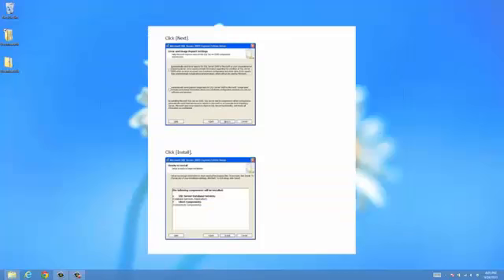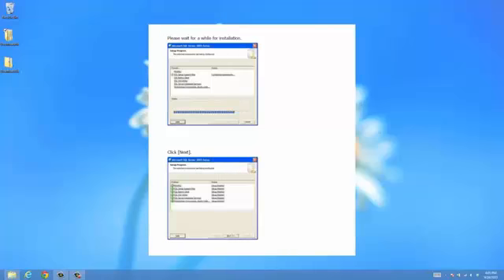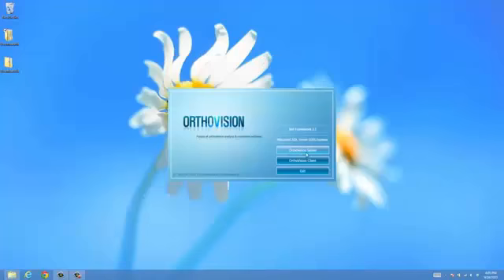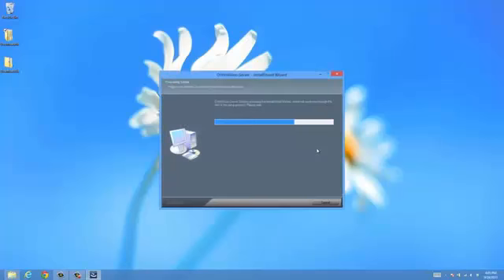The next window describes error reporting. You could choose to check those off before clicking Next. And in the dialog after, make sure you click on Install. You then have to wait for an installation and then watch for a system configuration check before finally finishing up by clicking Finish.